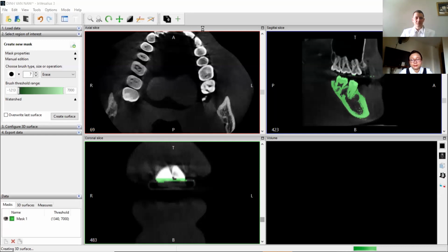Okay. Why it's not moving? No, it's doing the computation. It's just this step can take a little time depending on the computer. I mean, at least on mine, for this software, it's kind of slow. But all 3D software, if you use something like Slicer 3D, it's the same. In fact, relatively slow unless you have a super powerful computer.